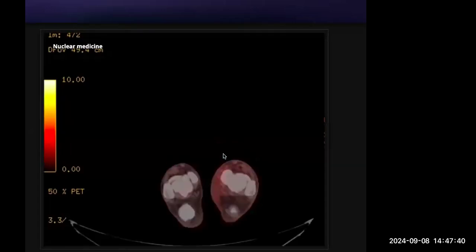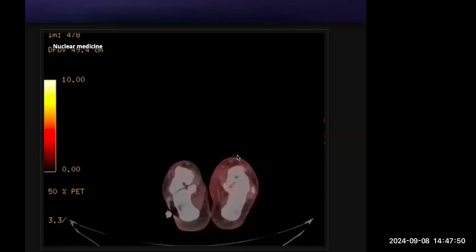Where should I ask for control? If you click the three dots on the top, you might see request control, I think. Yes, I got it. Just click and scroll. You might have to go slow because it's a lot of slices. Going from caudal to cranial.